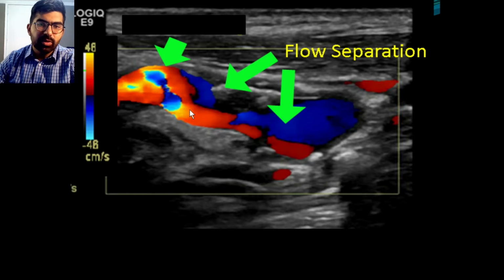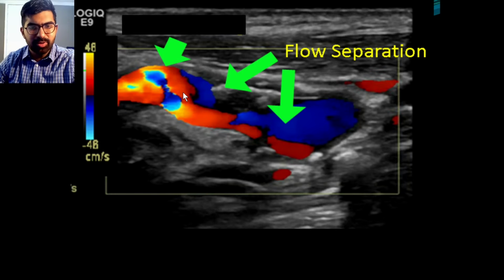Now, you notice here that there's some blue flow. Well, how is that possible, Dr. Schugle? Well, you can imagine as blood flow comes here, it's making a little eddy, and there's a jet going retrograde and then meets back up to go antegrade. So again, some kind of pretty pictures to give you some physiology as you're reviewing these things.